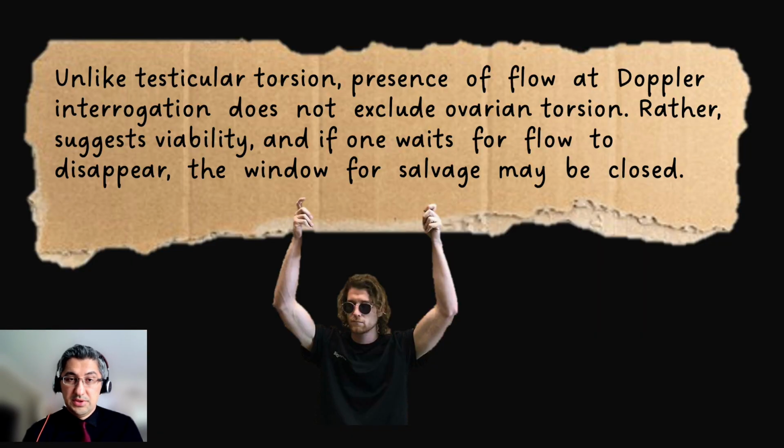Unlike testicular torsion, presence of flow at Doppler interrogation does not exclude ovarian torsion, rather suggests viability, and if one waits for flow to disappear, the window for salvage may be closed.